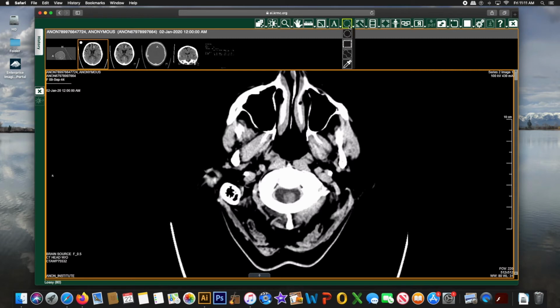The draw tool is next to annotations but acts more like a measurement tool. You can draw fields of measurements including ellipses, rectangles, ROI, and also get pixel values for Hounsfield units. Edit Annotations is the button next to the Draw tool, and this can be used to edit any on-screen annotations that you have made, or to remove one or all of them from the screen.